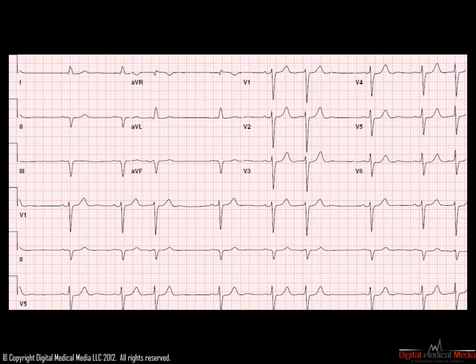As you look across the ECG, you will notice that there is a pattern. PR, PR, and then a beat which is early. PR, PR, and then a beat which is early. The early beat is a premature atrial contraction. Look at the shape of the P waves in front of the regular beats. This is a sinus P wave. However, the P wave in front of this early beat is different from the other two. This represents atrial trigeminy. Every third beat is a premature atrial contraction.